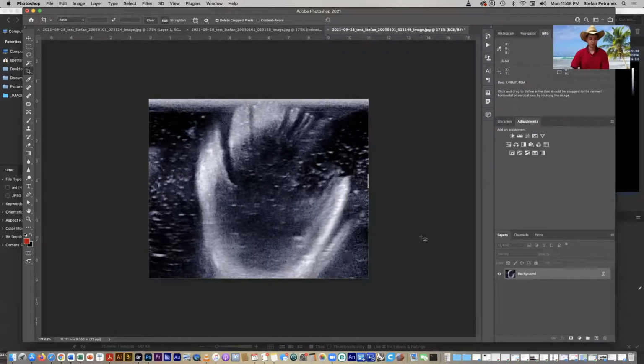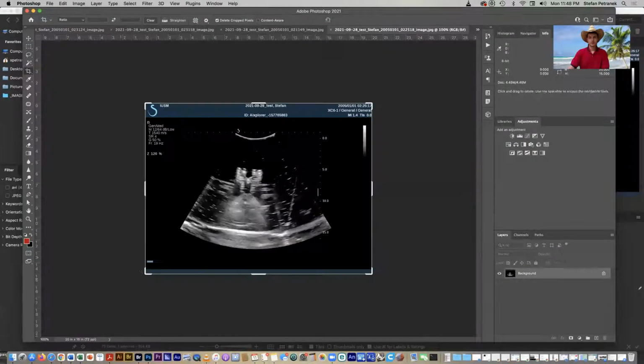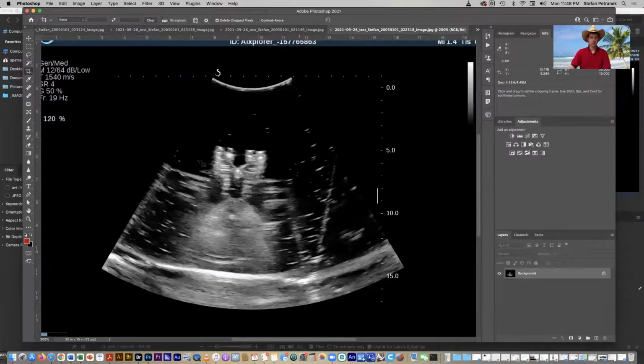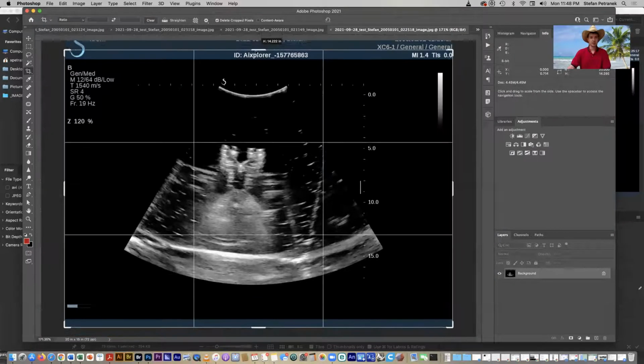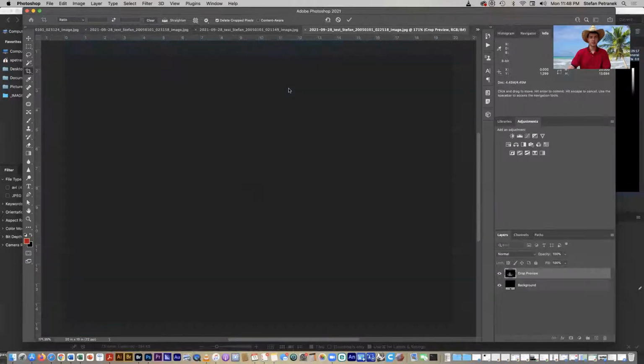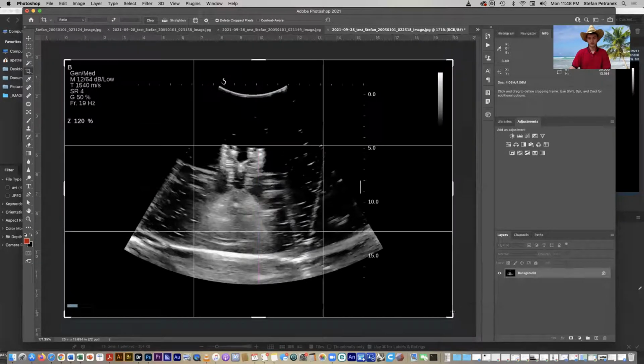However, let's say you've got one of these images over here, and you like some of what's going on here, but you don't like everything. How could you get rid of it? Well, obviously this top, if I didn't want this blue top, I could just come down and that might be a real easy way to do that. Likewise with this bottom over here.